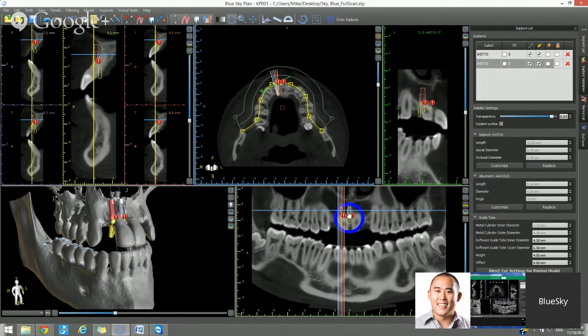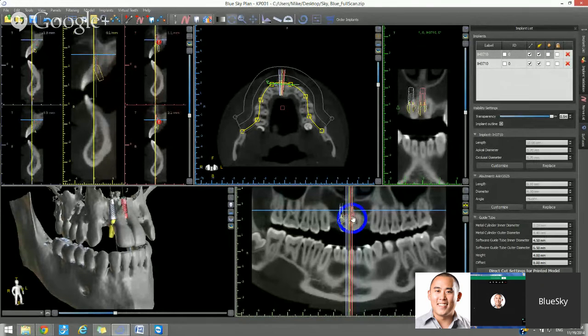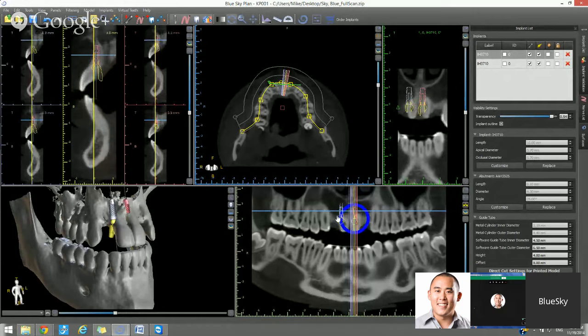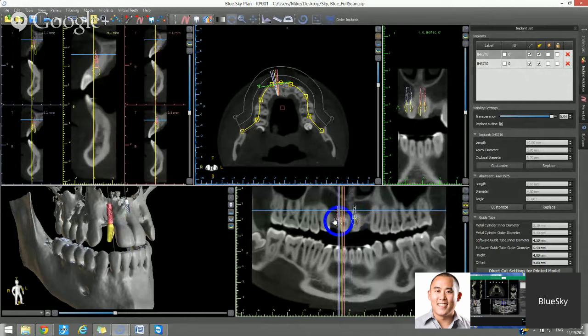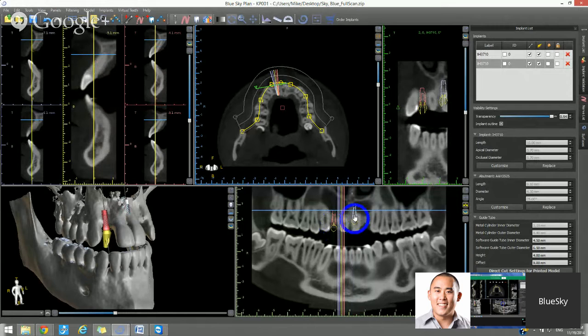And as we separate the implants, the red stops, the red exclamation mark disappears from the implants, and we're back in business. Okay, so that was the problem: we had the option of rotating around the axial only selected. That was preventing the implants from moving.